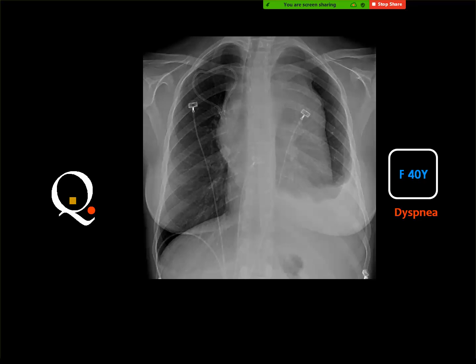Left side effusion. Pneumothorax. No. Mesothelioma effusion. No. Left side, there is pleural effusion, okay, but you see this very big mass in the mediastinum. Pulmonary edema? The lung is clear, but this mass is a mediastinal mass. And the mediastinal mass, which is central in location, then you may think of aortic aneurysm, retrosternal goiter.